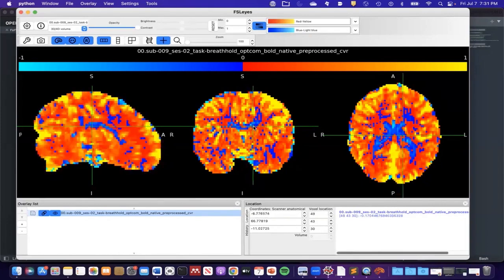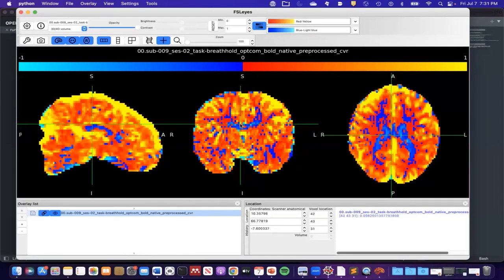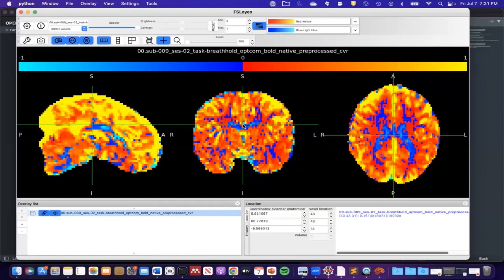The reason we use this inverted color scale is because we want to see delays that are earlier in yellow and delays that are later in purple. So let's first set the range here to 5 and orient you again to the color scale. 0 seconds is actually the median delay in gray matter, because this map is made relative to that value.